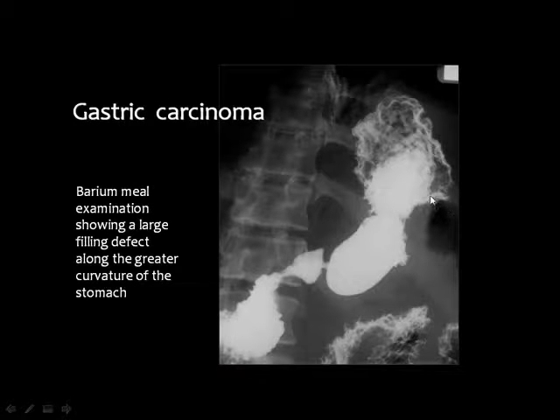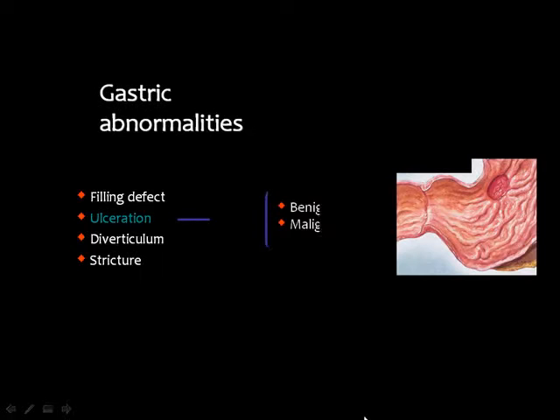This is a case of filling defect in the gastric body along the greater curve of the stomach, which is suggestive of carcinoma because of the marked irregularity of the wall of the filling defect.